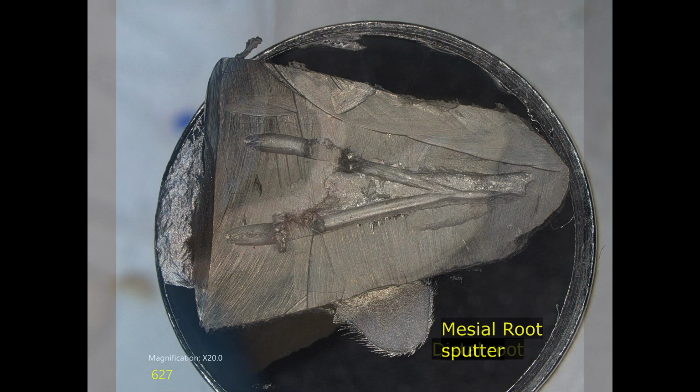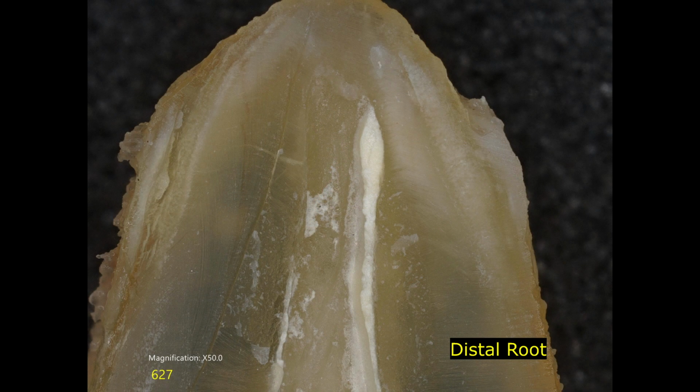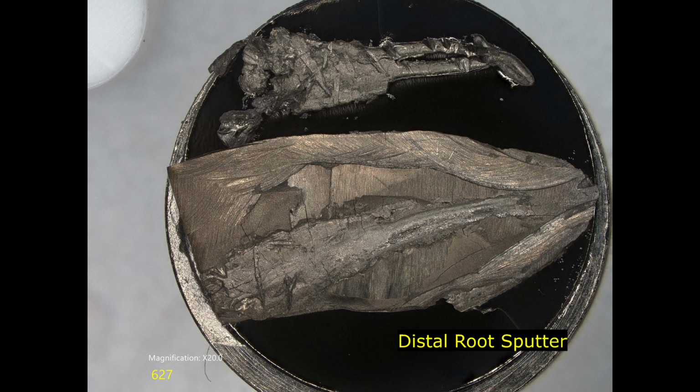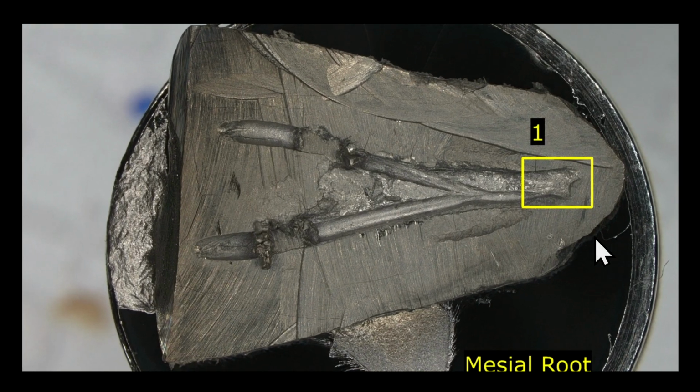Teasing the GP out of the distal canal was more difficult, but we were eventually able to remove it and gain access to some areas where the naked canal wall was evident. In other areas, the AH Plus sealer completely covered the canal wall. These are sputter-coated views of the distal root to help you with your specimen orientation. We will look at several areas.